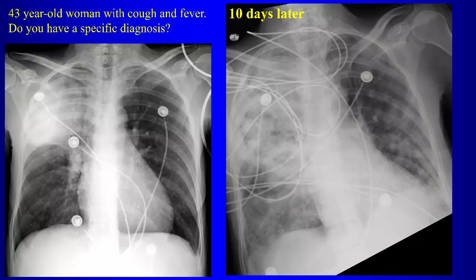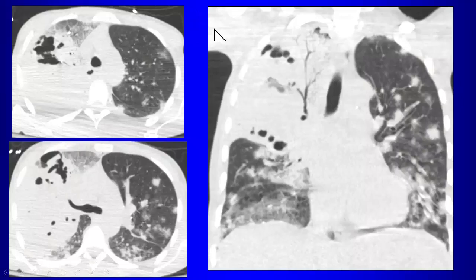So pneumonia that actually increases the size of a lobe is called Friedlander's pneumonia, and the organism associated with that is Klebsiella, although it can be other types of gram-negative organisms. You can see here the extensive consolidation that actually increases the size of the lobe, and now we have cavitation within this area of infection.